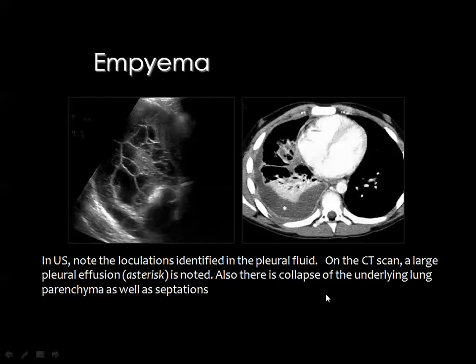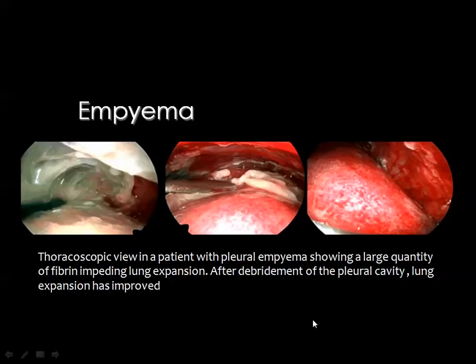This is a very important issue regarding ultrasound. And here you can see there is pleural collection and there are multiple internal septations, and these septations cannot be detected by CT. Then if you are going to drain this collection and you don't know about these septations, you got minimal results because of the localization of the fluid.